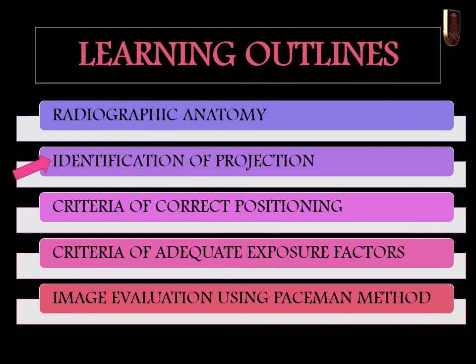Next, let's continue with the identification of projection. This is the initial stage of image evaluation. Identification of projection is important because the following criteria of image evaluation, such as positioning and collimation, will depend on the said projection.